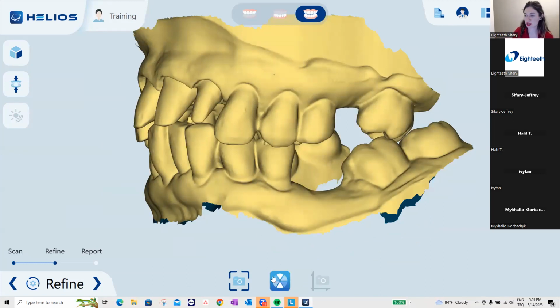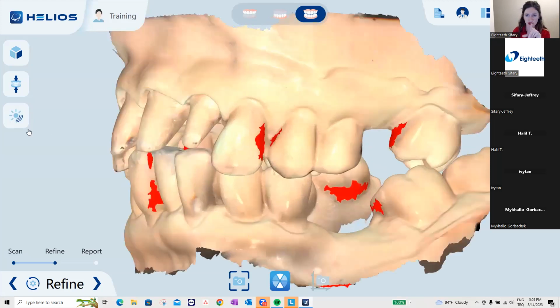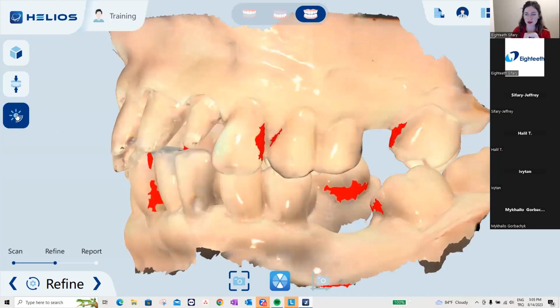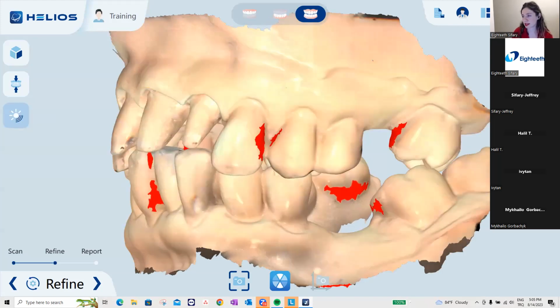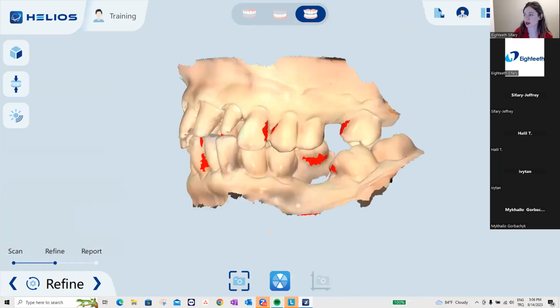You can change the color as you like. If it's too shiny, you can adjust the exposure button here with display mode, okay? And this one is, if you lost your way and can't find your model, you can just click and it will be centered for the model.